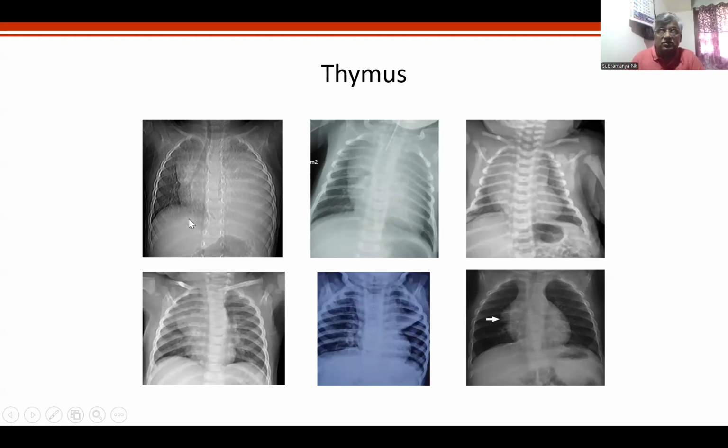See, now it looks like this was apparently later proved to be thymus rather than a pleural effusion. No, I'm just presenting to you. But here there is a problem. It could be pleural effusion plus thymus. That was what was told to me. I went through this case online, and it was a case of minimal effusion with a thymus. But the problem is, it is not that the fluid is present in the rest of the lungs. And here you can see it's called cardiothymus.